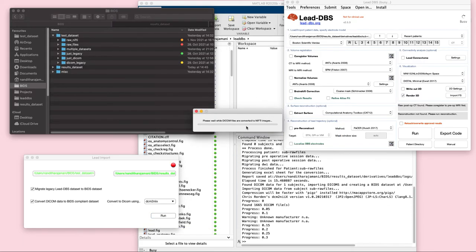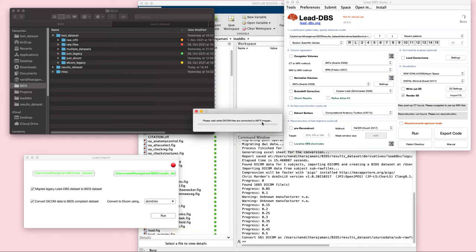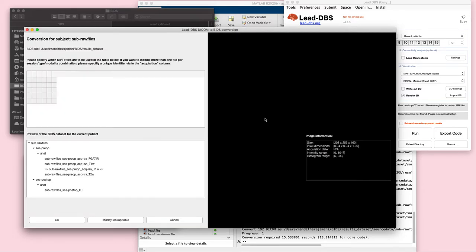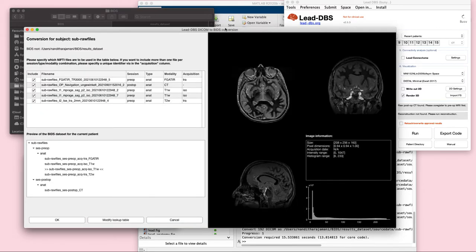You will now notice that the DICOM files are being converted to NIfTI images. This is now the new DICOM to NIfTI, NIfTI to BIDS conversion app.